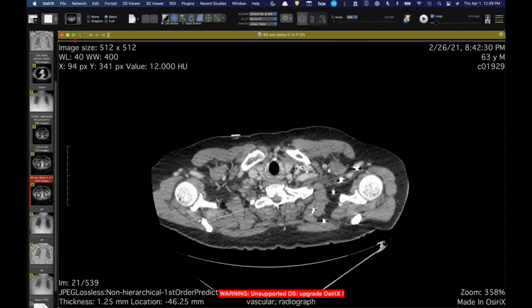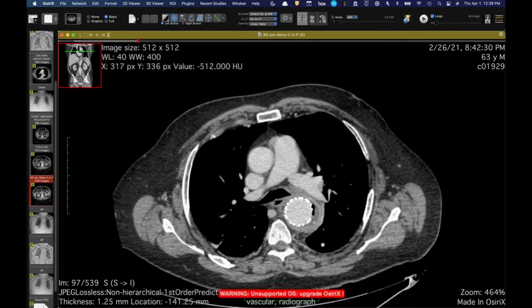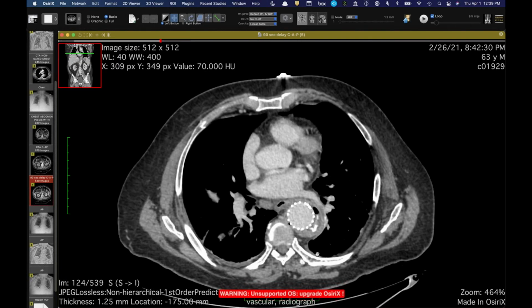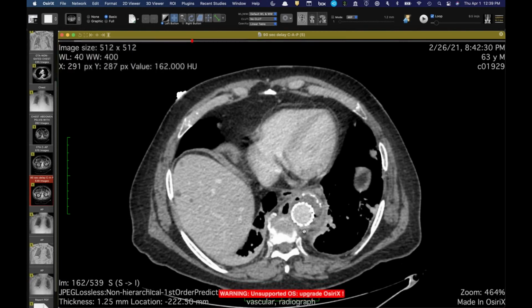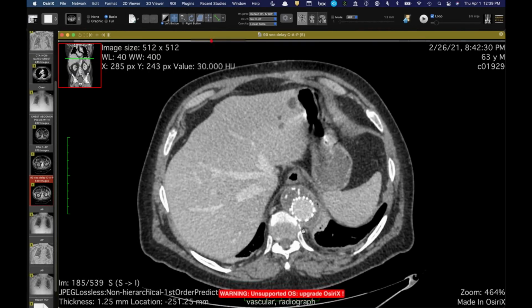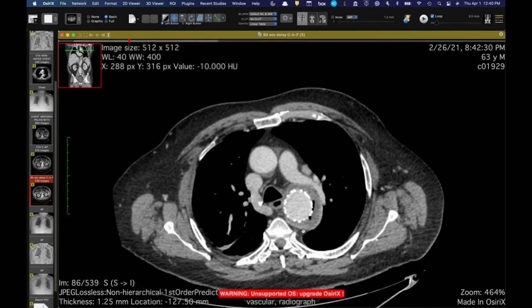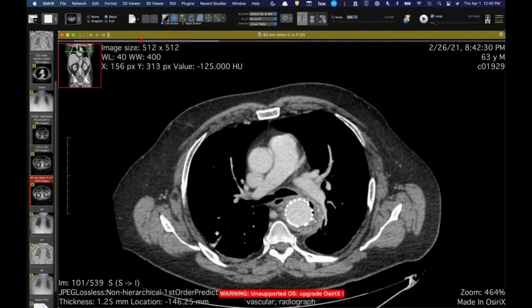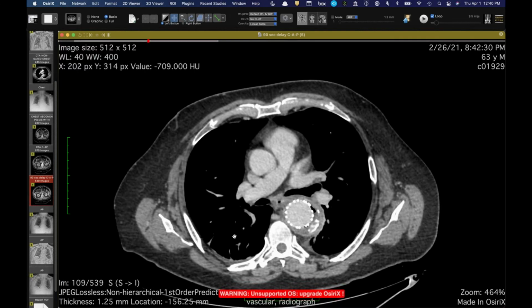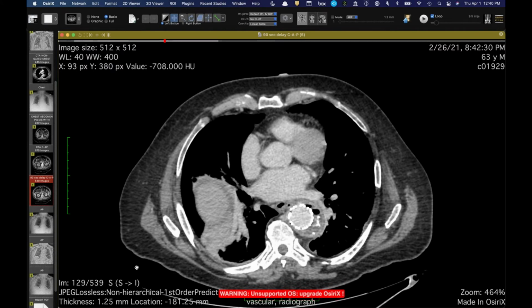And I've got a CTA, and even on the venous phase, you can see there's no filling. Obviously, there's no communication either way. Gas wasn't getting into anything else, and contrast wasn't getting into that. There are no other symptoms other than back pain and just symptoms of chronic infection. So he's been on IV antibiotics and just got discharged home on lifetime oral antibiotics for presumed chronic infection.